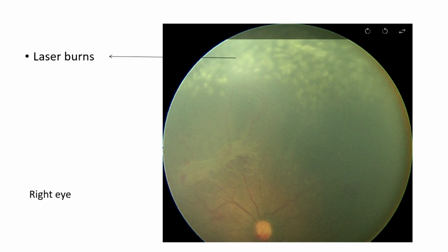Extraretinal fibrovascular proliferation is called popcorn. So these are kind of popcorn lesions. And many of these popcorn lesions, when they coalesce into a network, then you see a large tissue like this. In the very old publications, you will hear something called rear guard and vanguard.